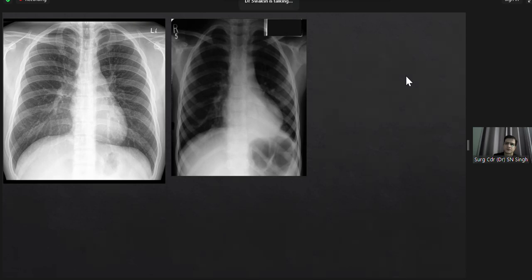So I'll describe the radiograph again, right? Please go ahead, in 30 seconds.